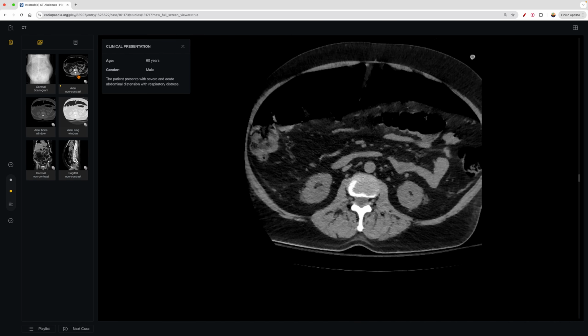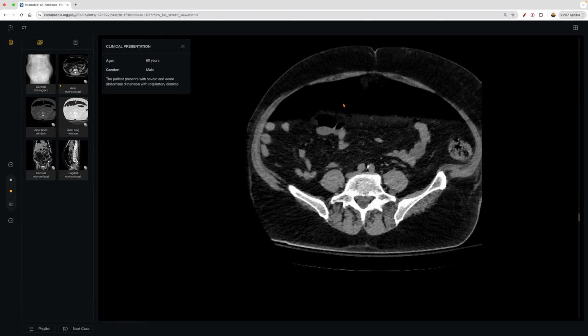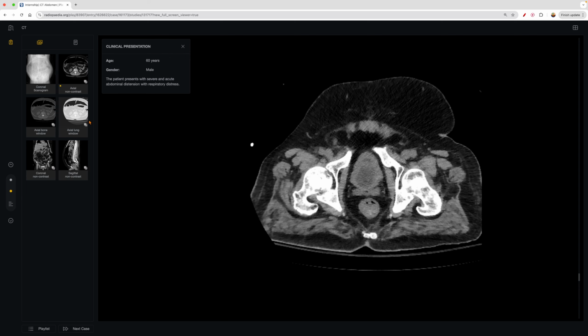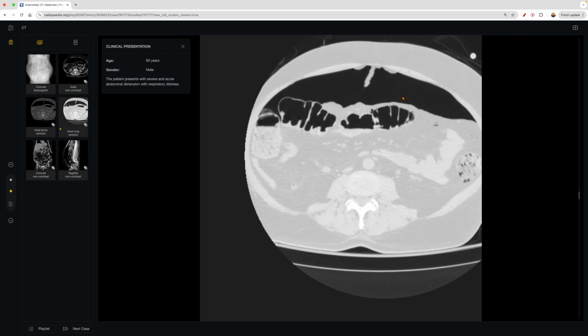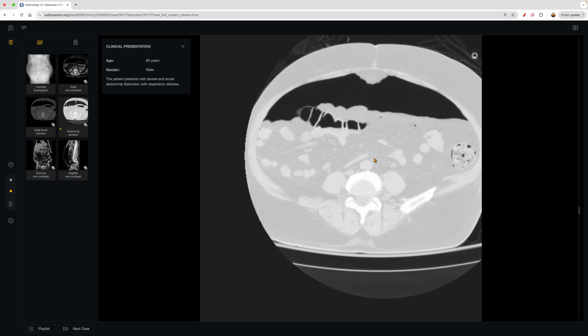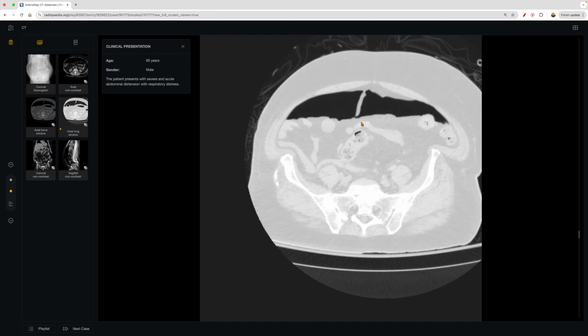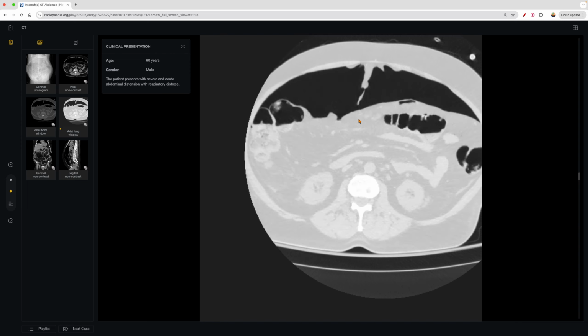And then now let's look at the axial view. And again, so now you saw the very mild form of pneumoperitoneum. Here's a very severe form where you can certainly see all that air accumulating, right? Now let's look at it from the perspective of a lung window and look how much easier it is to appreciate that. Of course, you want to make sure you're not mistaking the free air for anything within the bowel, but certainly you can appreciate the free air from the lung window.